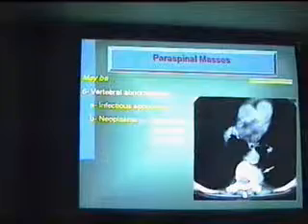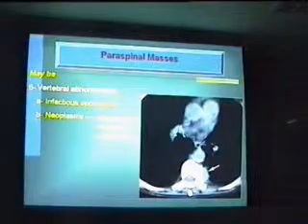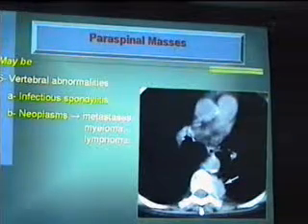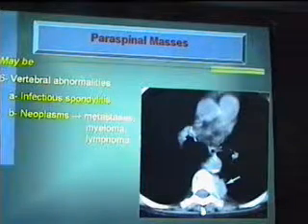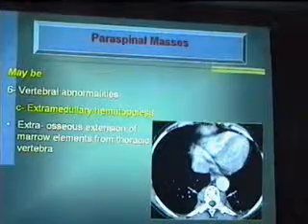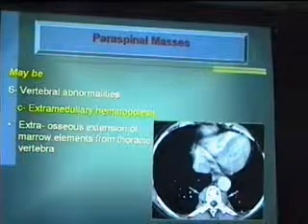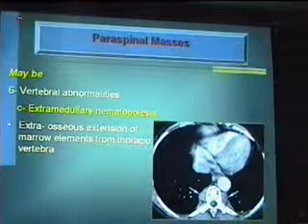Okay, other paraspinal lesions like vertebral abnormalities زي لو عندي spondylitis, TB of the spine or any other cause of spondylitis with a paravertebral soft tissue shadow. We can easily diagnose that. Or neoplasm of metastasis to the spine and the paraspinal or intraspinal component مثلا. Myeloma and lymphoma can cause as well paraspinal masses. وحاجة كمان مهمة قوي ما ننساهاش، what we call extramedullary hemopoiesis. في بعض العيانين بيحصل extramedullary، العيانين اللي عندهم anemias مثلا، بيحصل what we call extramedullary hemopoiesis. Extramedullary يعني outside the medulla.